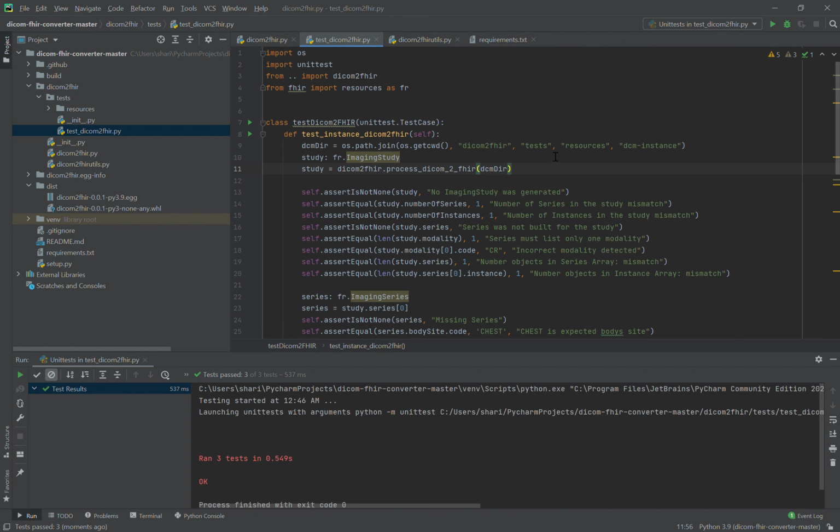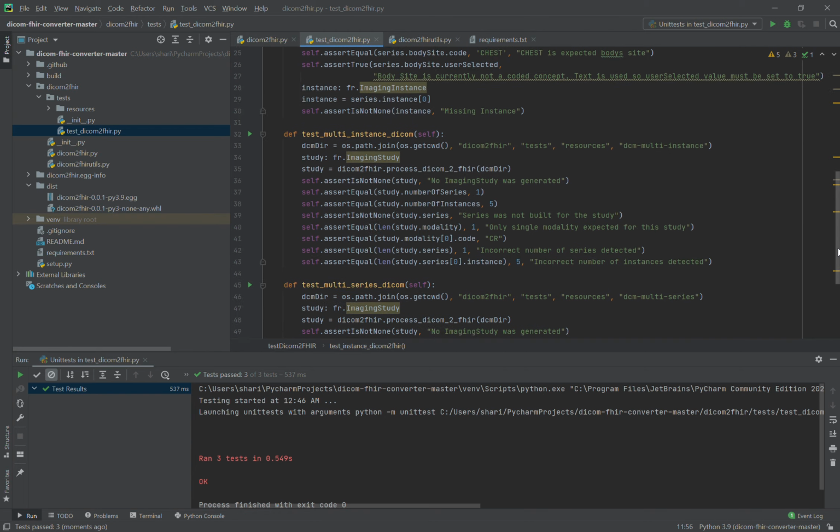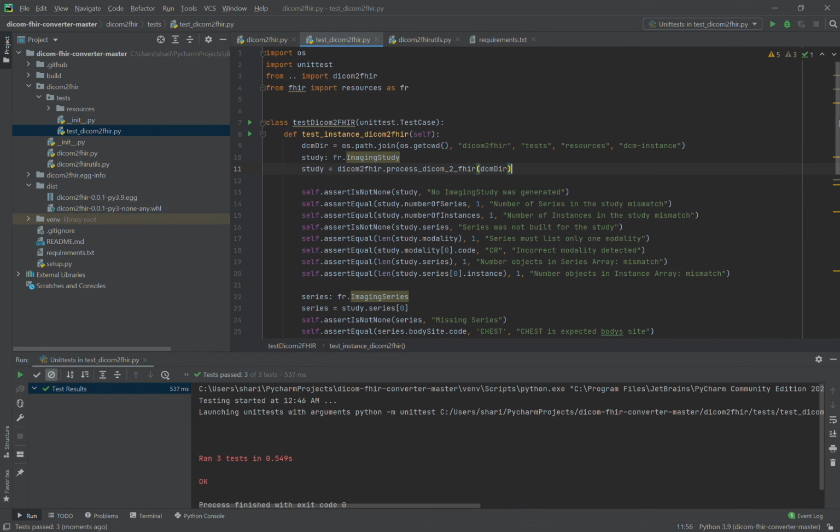Unfortunately, I don't have much sample data that could be completely read by the libraries. So I just created a little test case here based on what was available. But yeah, the library is pretty flexible, and it runs as expected. The usage is pretty straightforward, and more information can be found in my project document. And yeah, this was just a quick run-through of the deployment and the test cases of the library.